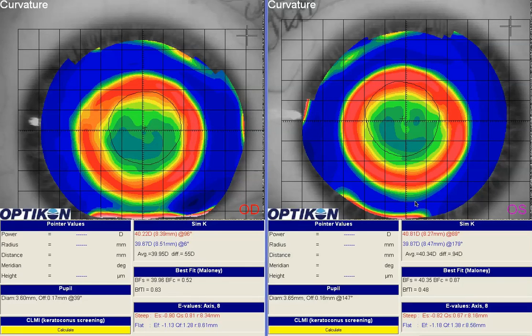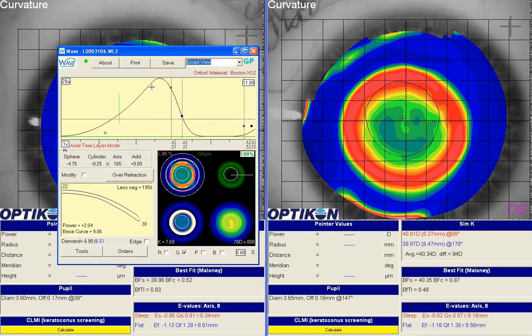This is an orthokeratology patient who's worn lenses for a little while now and is getting consistent problems with glare at night. It's not really getting any better and very distracting when driving. So we're looking at the posterior topographies, and similar to before, it looks like both lenses are sitting a little bit low. And if I bring up a lens design, I believe this is what we're working off of.